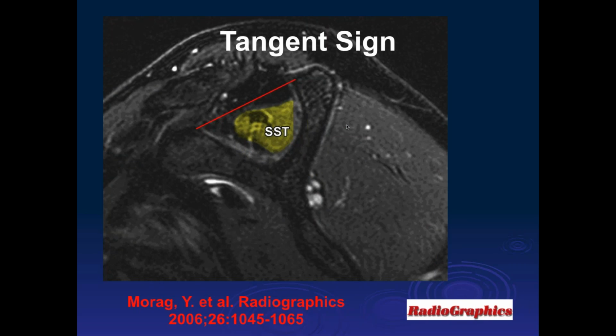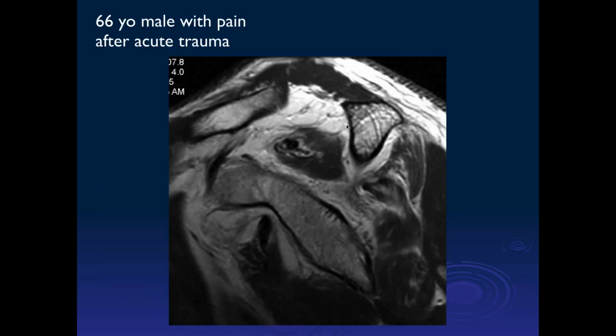So I want to point this out just to strongly recommend that you not use this sign. And the reason it's not good is that, let me see. Well, let's go to the next case.